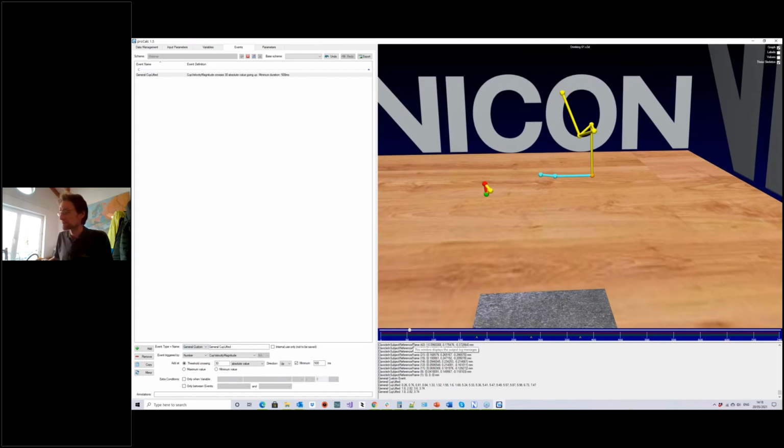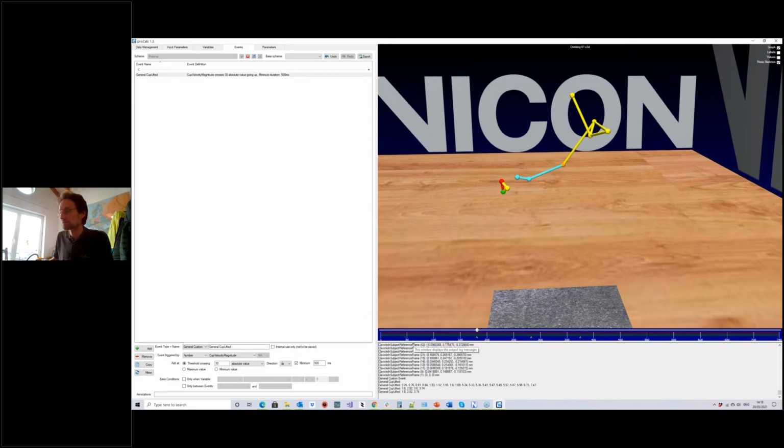And I don't really want those events because this is a cup lifted event. So I want to find a second criteria to avoid these two events being determined. And this is where the extra conditions come into play, because I can say only when the variable, which I've already calculated because I planned it, the length, namely the cup vertical displacement, is lower than, for example, 10 millimeters.